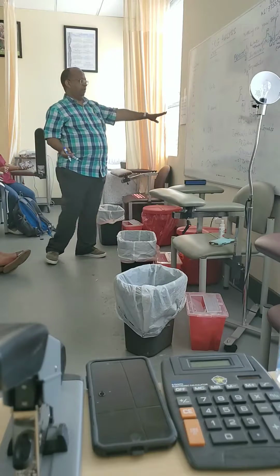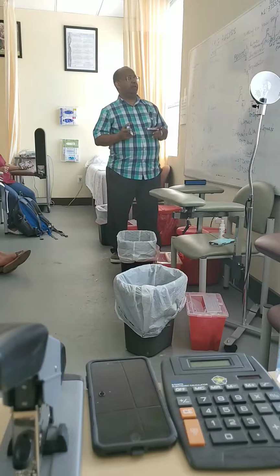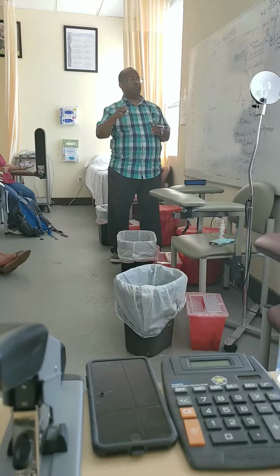All right, let's get back to this PR interval. We will come to it. Everything I will discuss, so that the recording continues.